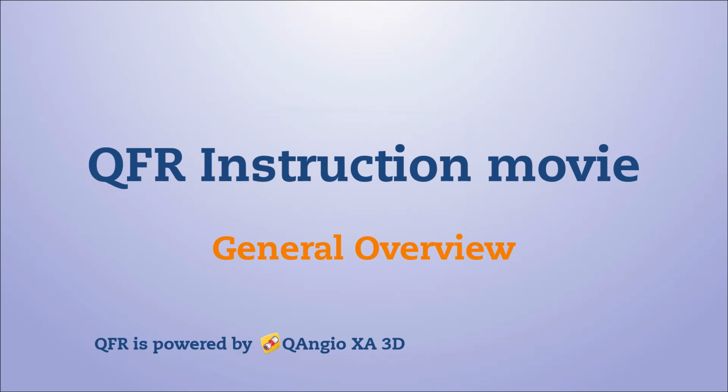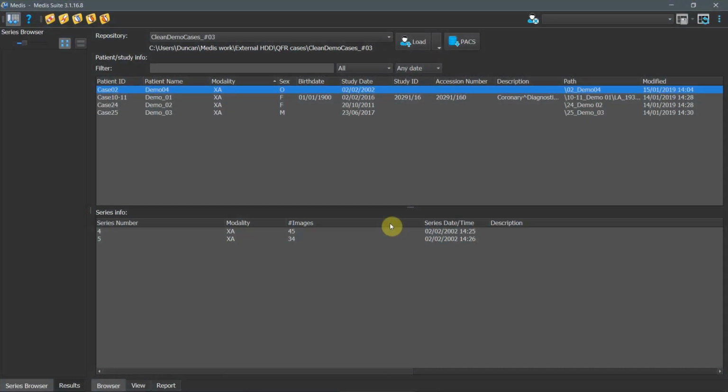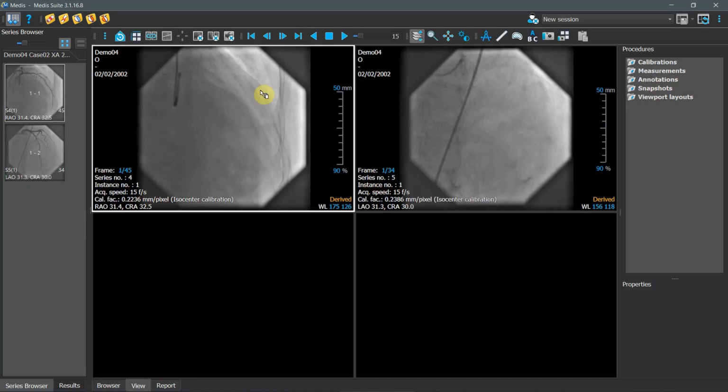Welcome to the QFR explanation movie. Here we show you how to perform a QFR analysis. We begin with loading in the patient images by double-clicking on the patient row. And as you can see here, the images are loaded into the viewer.